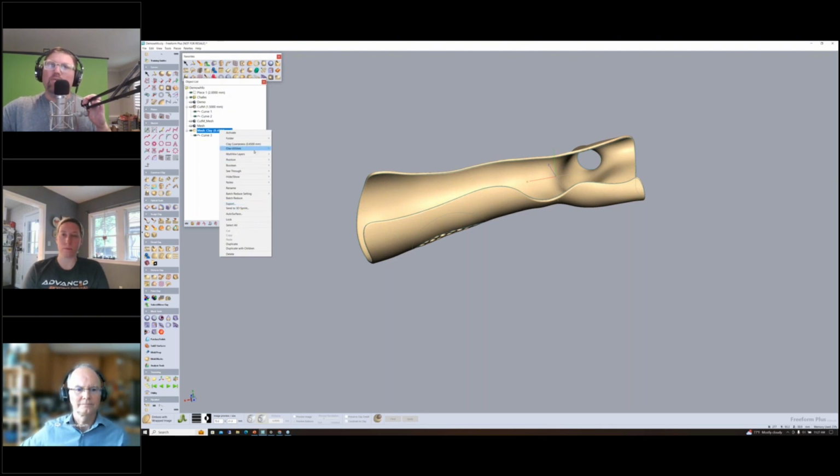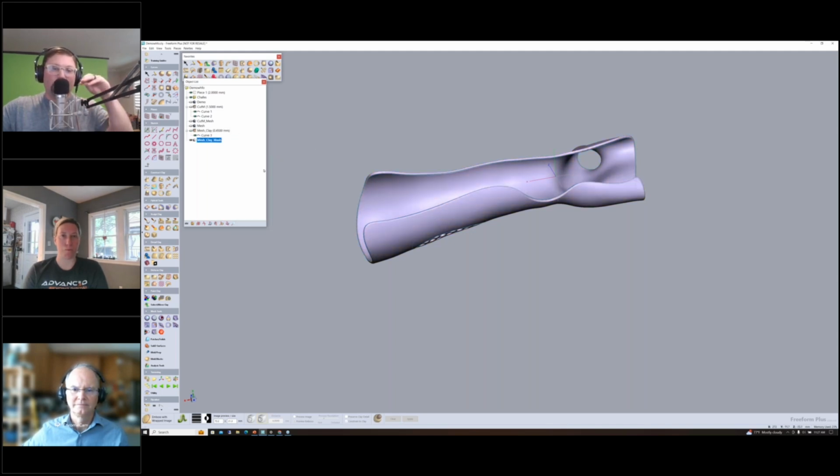So what we've started doing as a best practice is we've taken that clay and put it back into a mesh. And I will say, on the export side of things, you can export into a 3MF, STL, PLY, and there's a bunch of other ones, OBJ, 3MF being a much smaller file, and you guys are part of the 3MF consortium too, I might add. So if Duan is watching, thank you for running that.